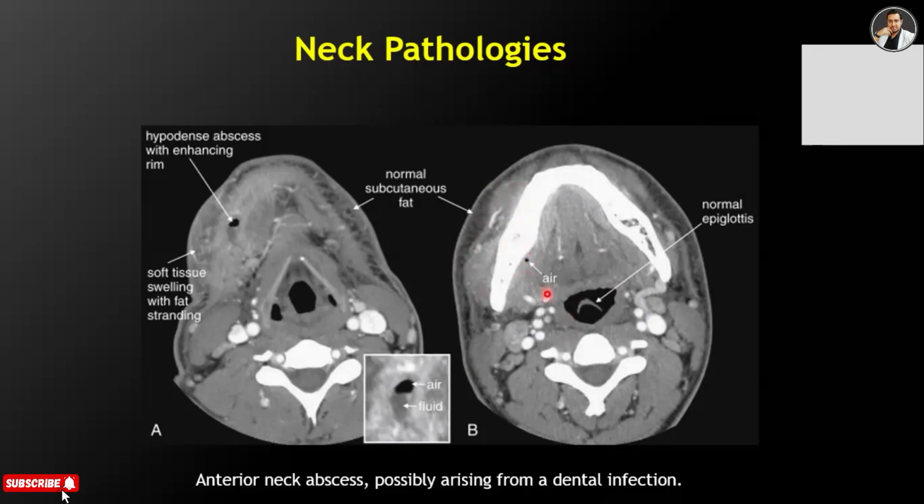So here we see the enhancement. Here is the pathology. And here we see the air fluid level. And there is a difference in density in the abscess. And there is pus.